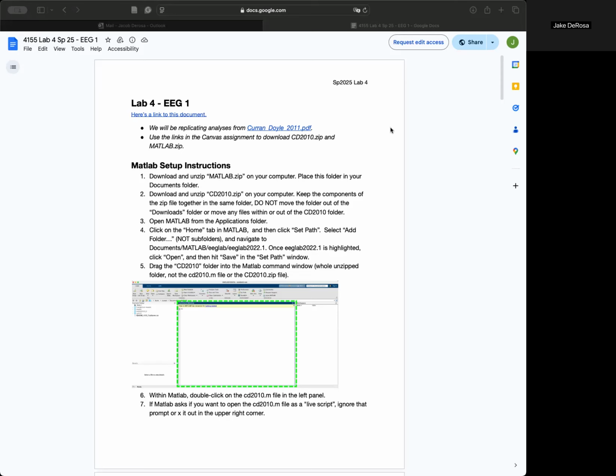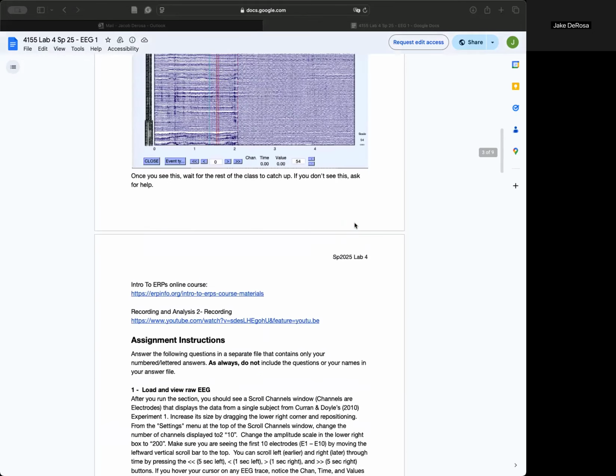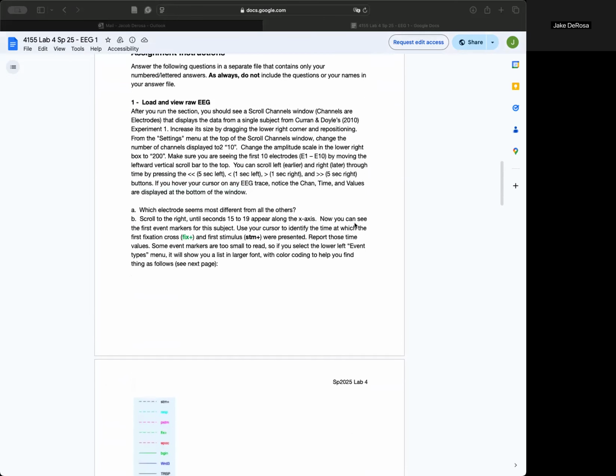But what we're really going to be doing just for the final few minutes of this pre-lab video is making sure that your paths are set up and showing you how to run the script and the various questions that you're going to be working through today in MATLAB. So briefly, we'll just stay in here.